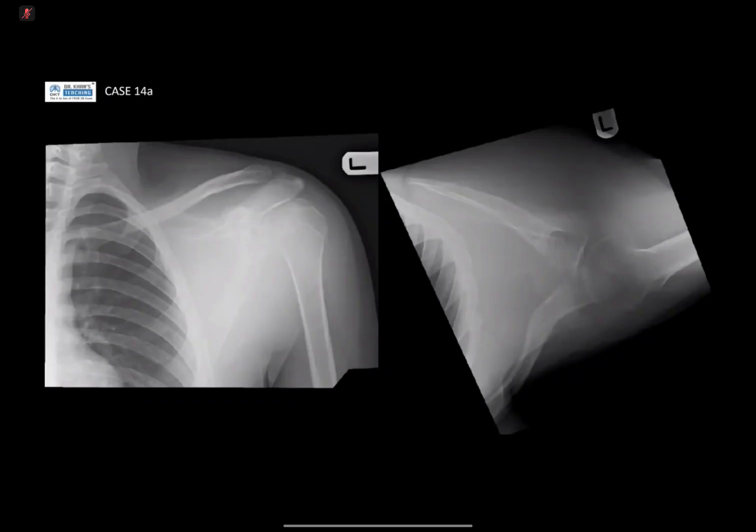But on the frontal projection, I see an increased density overlying the scapula, the glenoid, humerus. The glenohumeral space is not well visualized, and an increased density is seen in that place. More of a soft tissue etiology I'm suspecting, and for further comment I would go for cross-sectional imaging. Looks like an aggressive lesion, probably involving both soft tissue and bone.